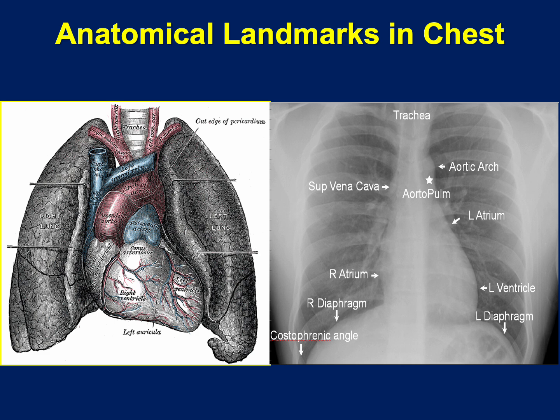I have placed an anatomical landmark cartoon next to it to show that there's significant correlation between what we see on an X-ray and what can be visualized on gross anatomy. The main significant structures are marked on this X-ray for you to review.